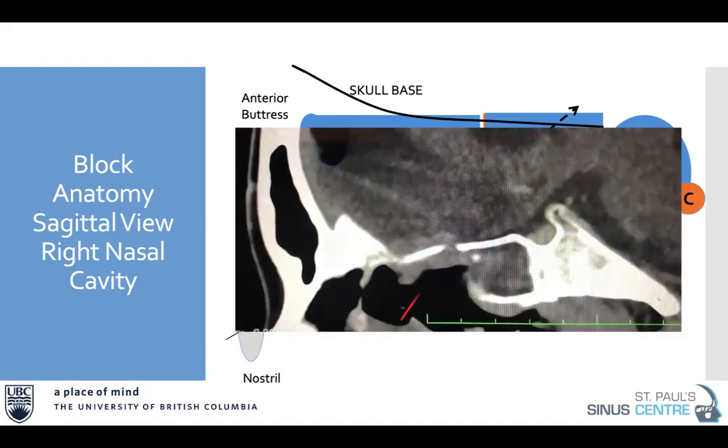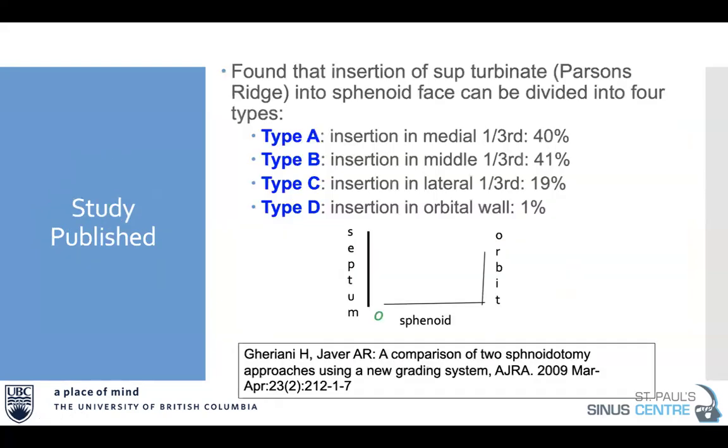So here is a case where the surgeon didn't make the turn. This was fairly recent and went into someone's brain and damaged the patient. So you want to be very careful that this doesn't happen. It's called the lost surgeon.